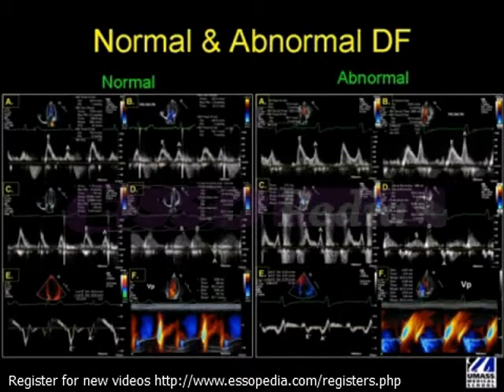But if you look off to the right, we see that there's a blunted systolic waveform, which could be a product of atrial relaxation or some atrial dysfunction included. And also the D wave is increased, so the S to D ratio is inverted, and the D wave is more prominent, consistent with elevated left atrial pressure, as that reflects the E wave. And then if you see below the baseline, the A wave duration is prolonged, and the atrial reversal velocity is slightly increased, or just above normal.